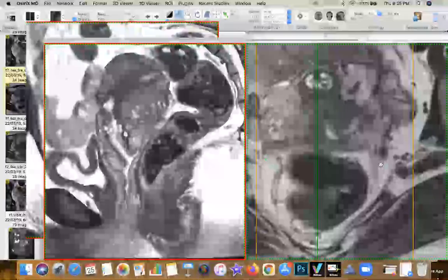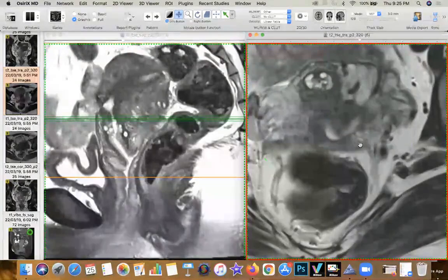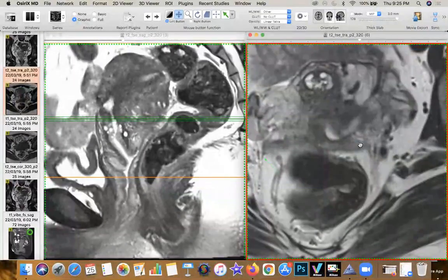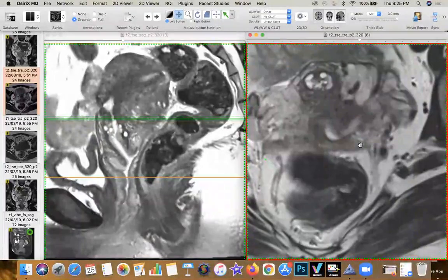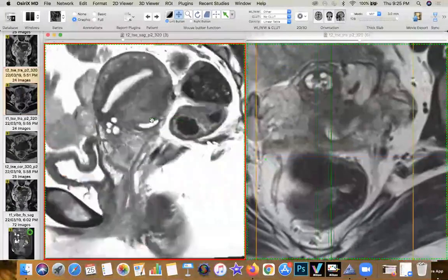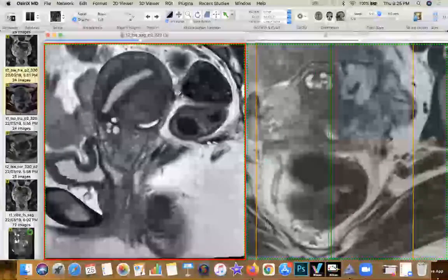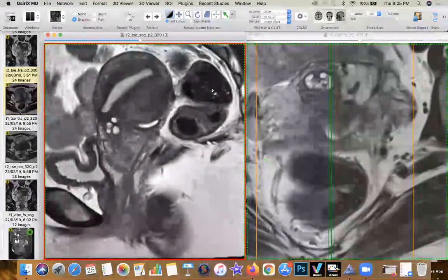So the first case which I've shown is a classic mid-compartment deep pelvic endometriosis, typically along the posterior serosal surface of a corpus, causing the acute retrotipping of the fundus, subserosal infiltration, and obliteration of the rectouterine pouch with involvement of the uterosacral ligaments. What else do you see in these patients? The next thing which you see, if you remember, I showed you these band-like structures which are seen at the level of the peritoneal reflection and above it. And basically what's happened is the rectouterine pouch has got partially obliterated.